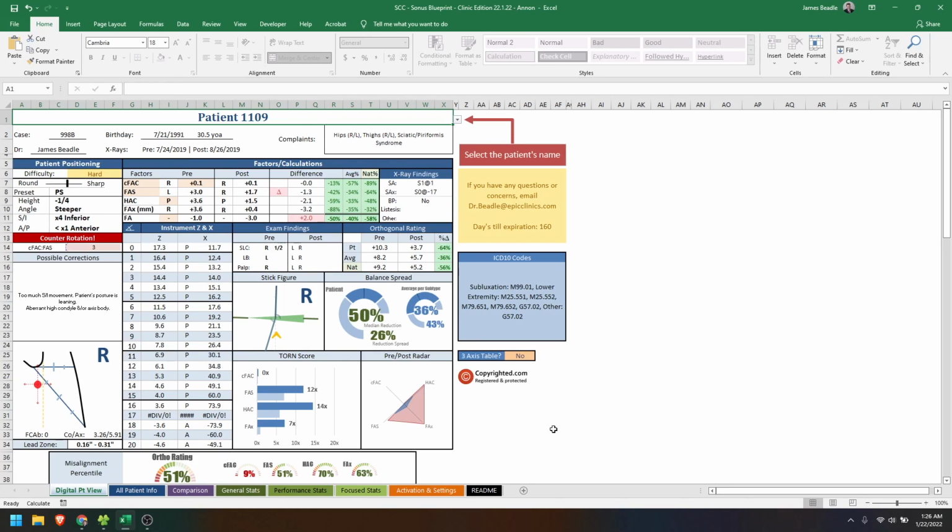All right, guys. As you know, we've had a pretty massive update with Sonus, and I wanted to go through at least some of the major highlights to help you understand what some of these updates are and how they apply to you. I've already had a lot of phone calls and emails asking, "Where did this go, and what does this do?" So I'm just going to do a fairly quick video to let you know what's going on. Without further ado, we'll just get started.